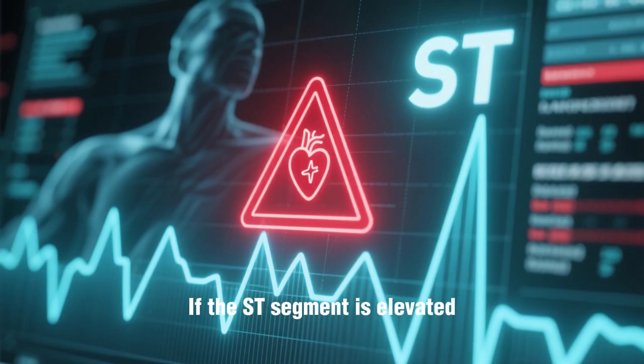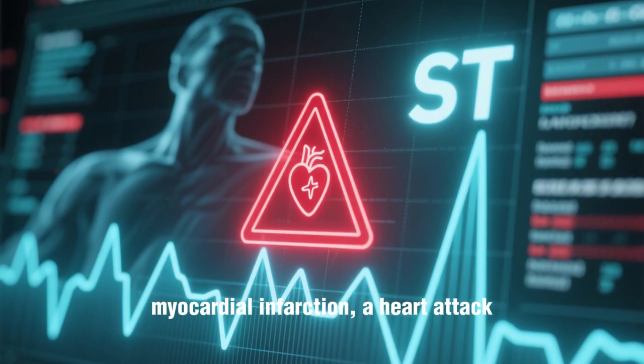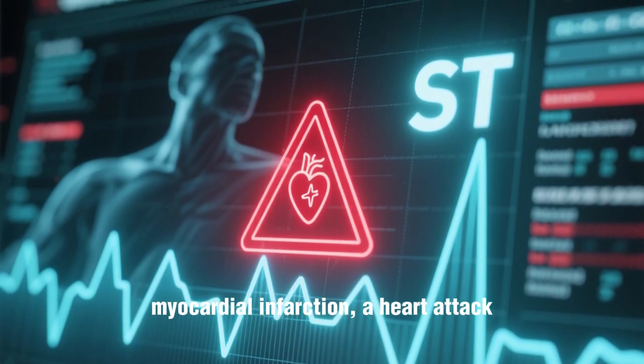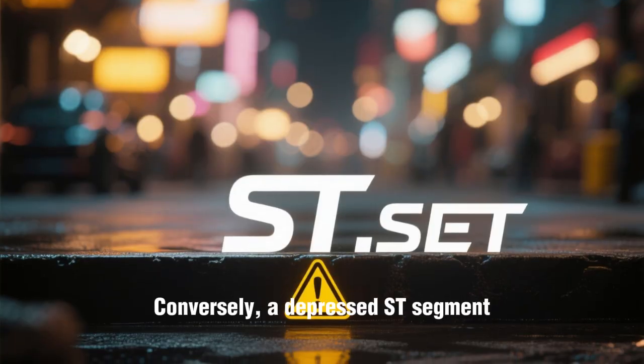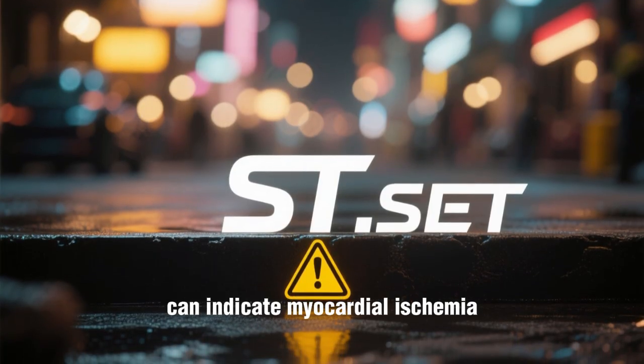If the ST segment is elevated, raised above the baseline, it's a classic sign of an acute myocardial infarction, a heart attack. Conversely, a depressed ST segment, below the baseline, can indicate myocardial ischemia.